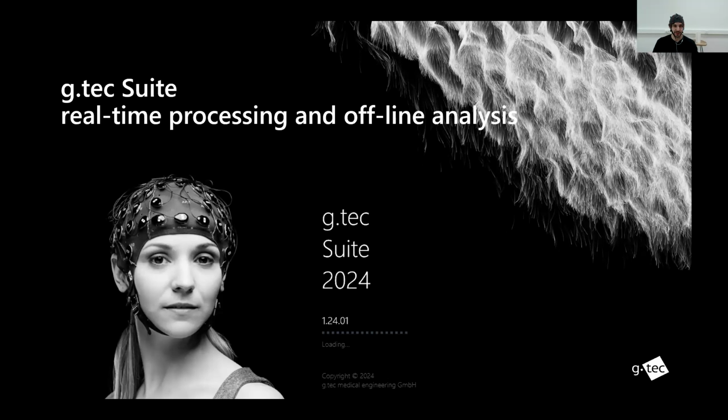Christoph already mentioned, I'm going to present the g.tec suite, and I already reassembled the cap on my head because it's going to be a live demo. I'm going to build some signal processing chains that can acquire and process EEG in real time to get band power features and a P300 experiment that I'm going to show you in this talk.